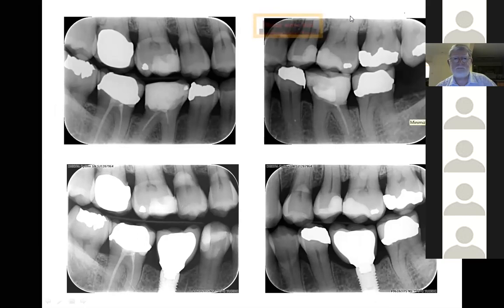So we're getting a lot of poor endo on 4-6 in our responses. Yes, and 3-6. Well, no endo down those canals at all. What are these things here floating around up there? Abrasion lesions or class 5 fillings? Class 5 fillings is what we're looking at, yes.